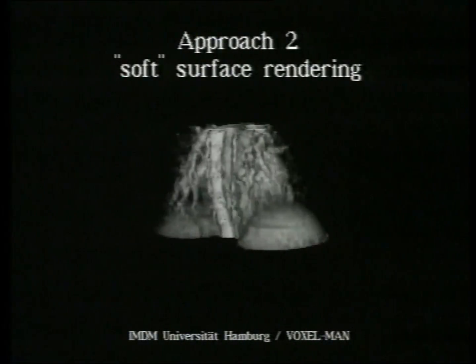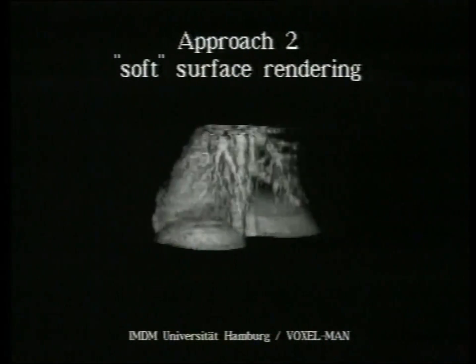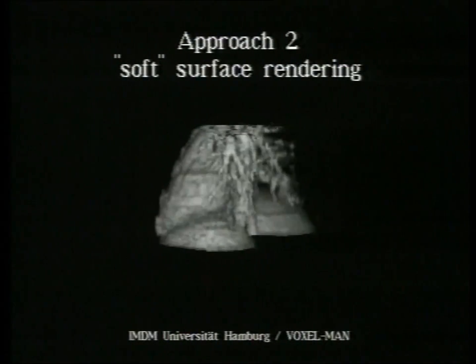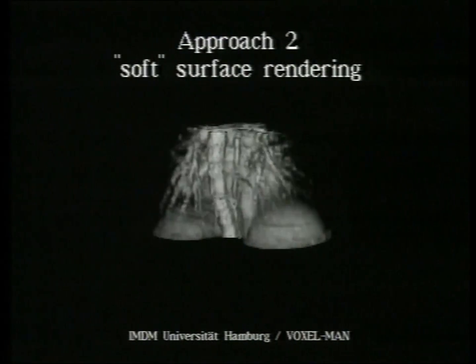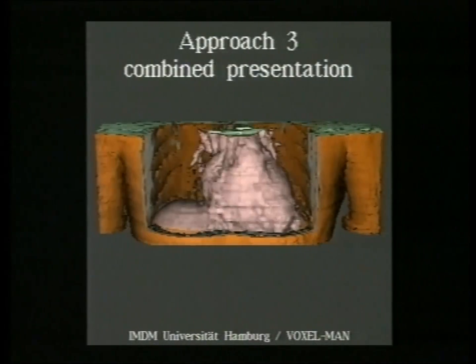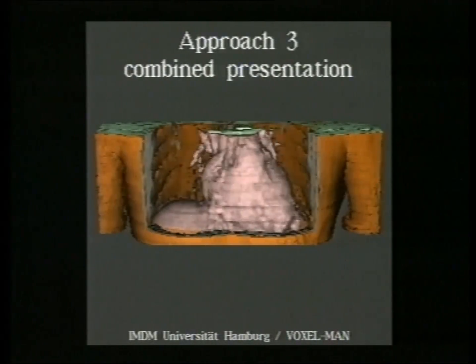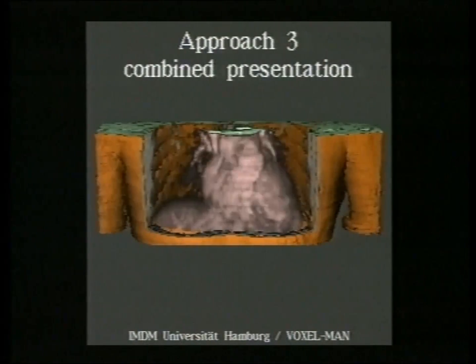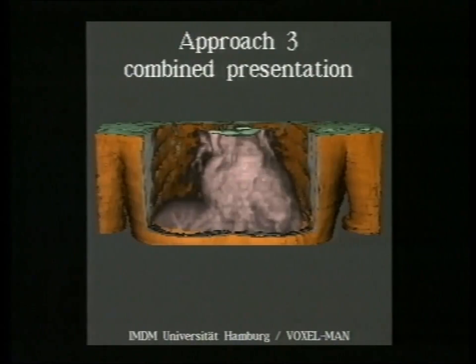Volume rendering gave these results. The beating heart, pulmonary vessels, and a diaphragm could be inspected from all directions. A combined mode, volume rendering for the heart and surface rendering for the exterior, seemed to be the best. Changing transparency made hepatic vessels visible. Coronary vessels were not present in these data.